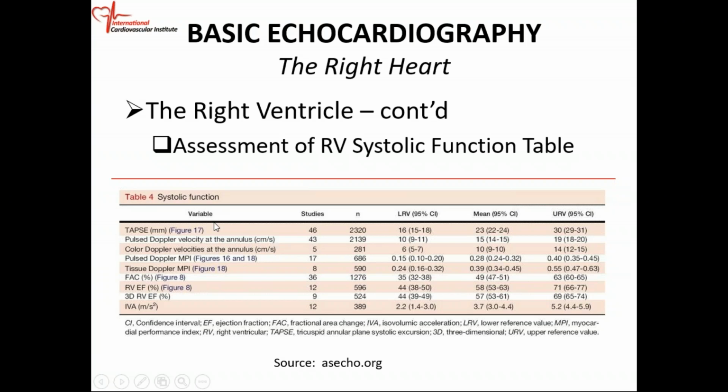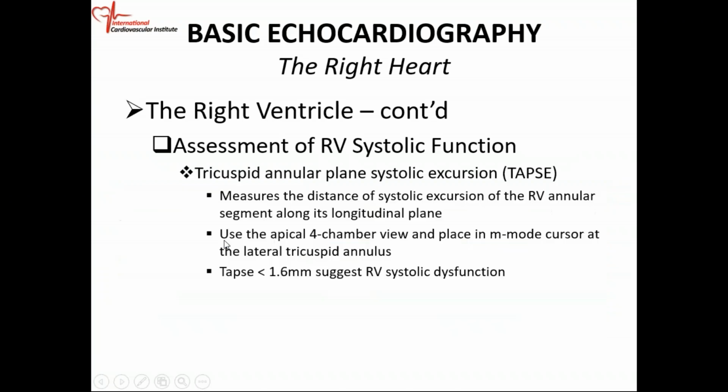are TAPSE and the RV systolic velocity. So when we do TAPSE, most institutions do this, and you probably should do two methods.